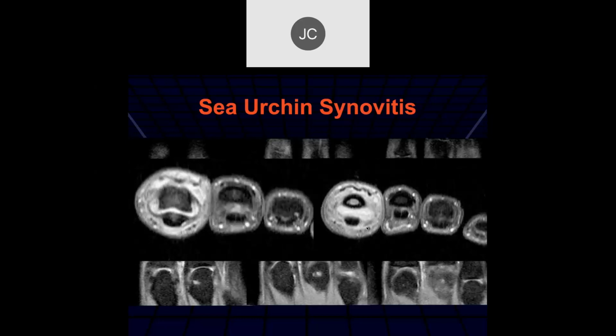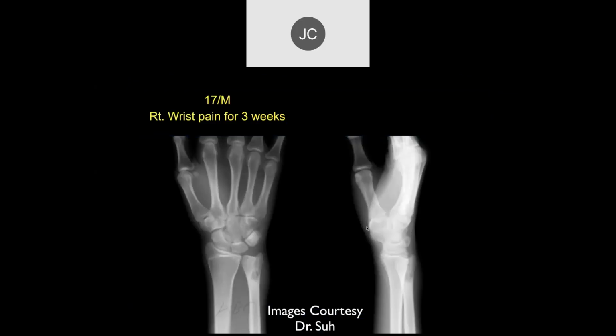There's some debate about whether a lot of these are infectious, but I think sea urchin synovitis is generally thought to be a reaction to the toxins. But they're extremely painful, yeah, but you always have to be worried about infection with these as well. Okay.